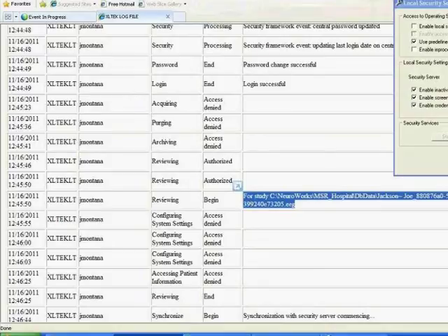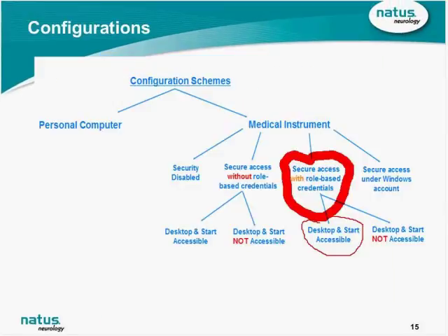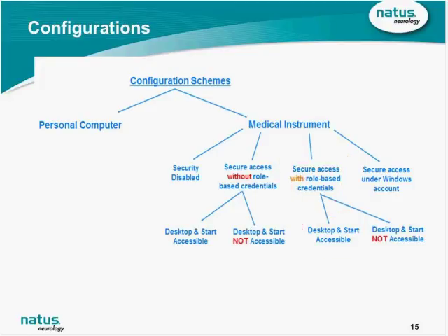Okay? Alright. The intent today was to provide you at least with an introduction, an idea of how to set up security, and I focused on probably the most popular one that I see used, which is this one here. And I see a combination of people disabling the desktop and start button and those that want it accessible. We could have spent more time on this, but again, in the interest of time, I decided to focus on what I felt was probably the most popular one.